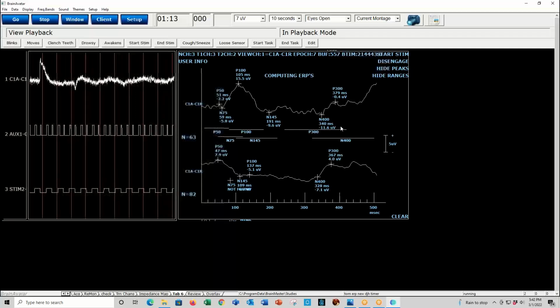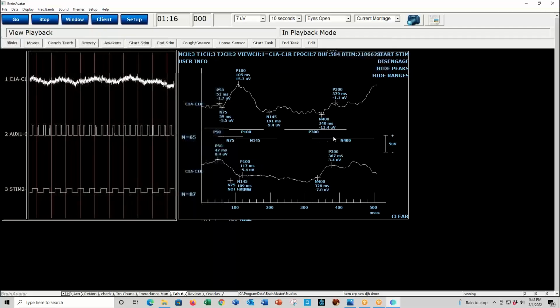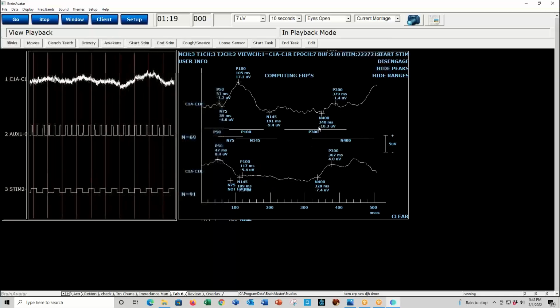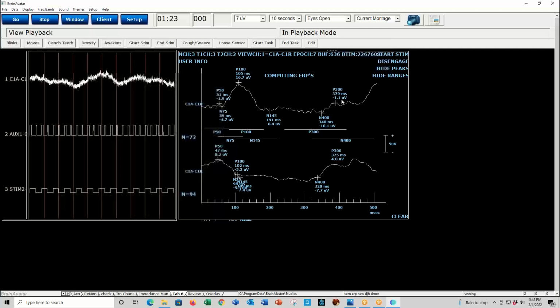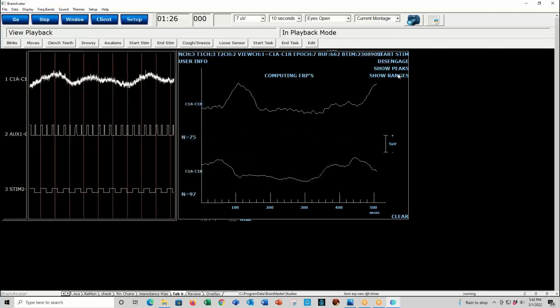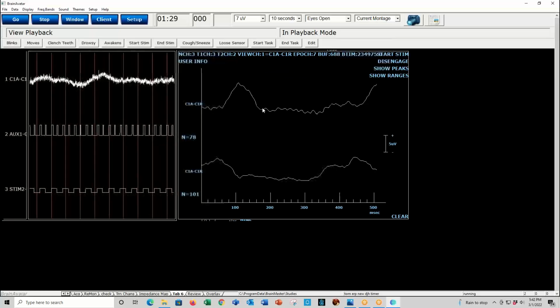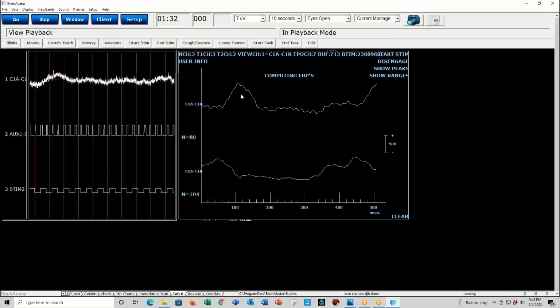And you'll see the ranges are very wide, so that negativity that falls within the N400 is actually preceding the positivity that's being assigned to the P300, but that's because the algorithm is designed that way. We can hide the peaks, we can hide the ranges, and then just see this is the evoke potential that's being developed. Here's 78 averages in it now.